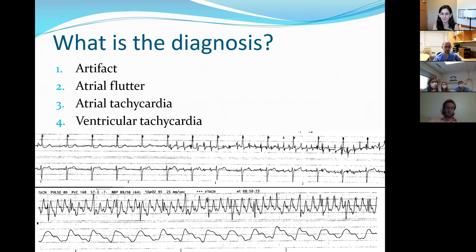All right, votes are coming in a little more slowly, I think as people take time to really look at these strips. So go ahead, put your nickel down, make your very best guess. And there we go. Okay, good. I will go ahead and close the poll and share the results. All right, 50% of you, good work. And the other ones, great job guessing. I love that you've put your nickel down, as Gabby has said.